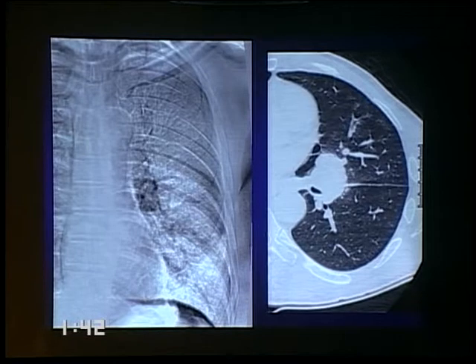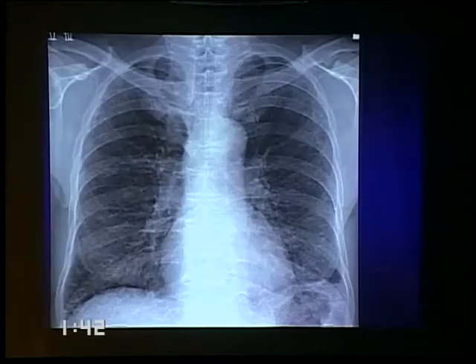So the bottom line is that temporal subtraction makes it pretty hard to miss these little cancers that are so easy to overlook otherwise. Here's an example from Japan, patient being followed with interstitial lung disease.